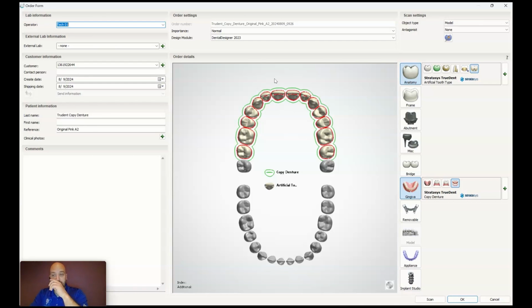But if you're concerned about a longer design process, when you're doing the coupling mechanism, you have to do it once for every individual tooth or bridge. So you can bypass that a little bit by bridging all the teeth together, and then you'll have a shorter design process. The only issue is that your denture just won't look as individualized sometimes where the teeth are. It depends on how the papillas look and things like that in between the teeth. So I would take it case by case.